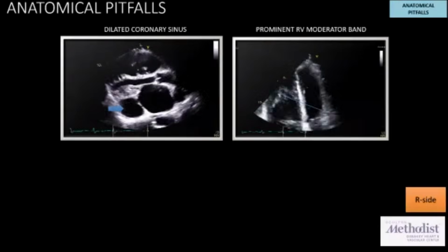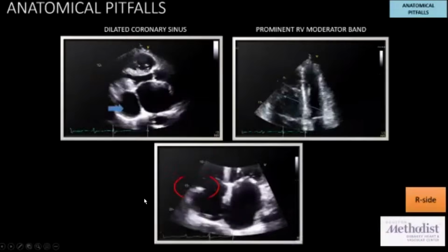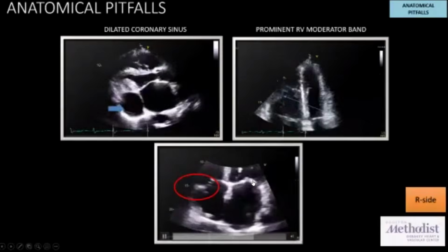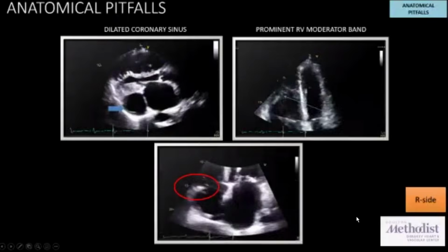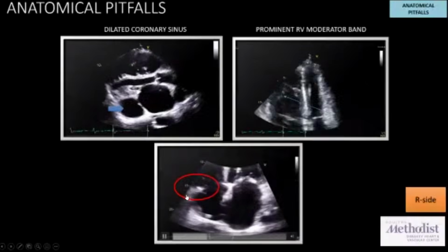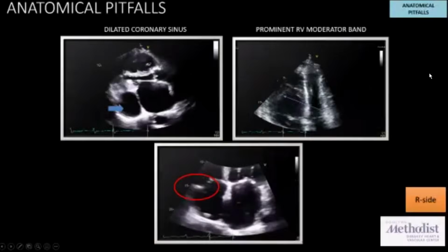in thickness and shape. And finally, in this video here, you see the echo density in the tricuspid annulus. In this one, it's basically dense annular calcification. As you see, the mitral annulus is also densely calcified. The other structure which we can usually see in the tricuspid annulus is prominent epicardial adipose tissue as well.